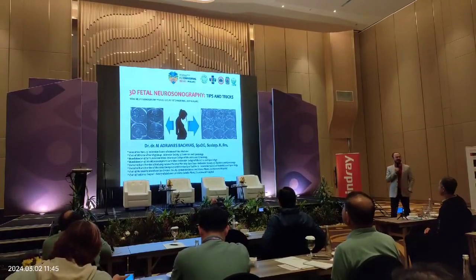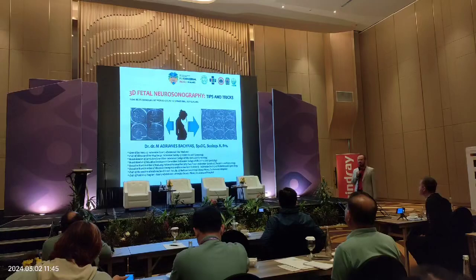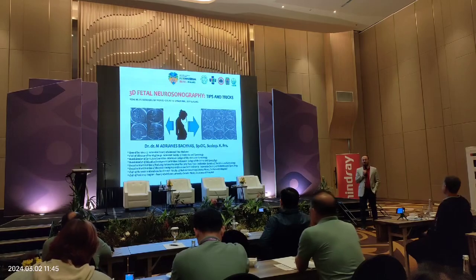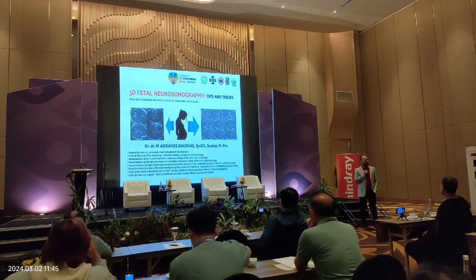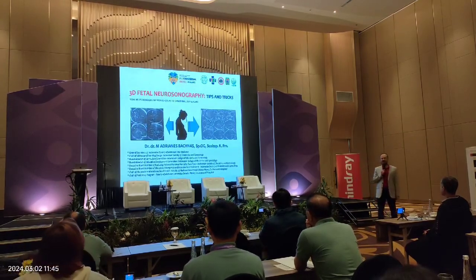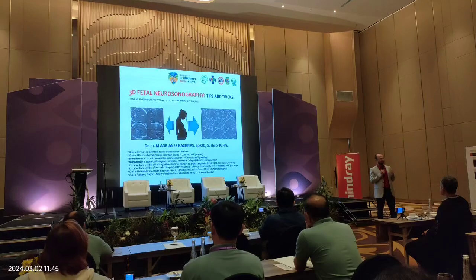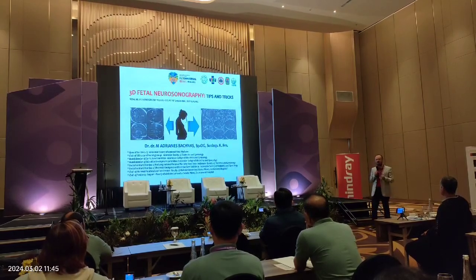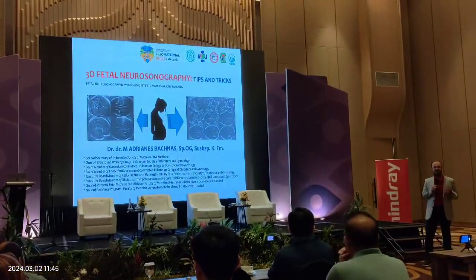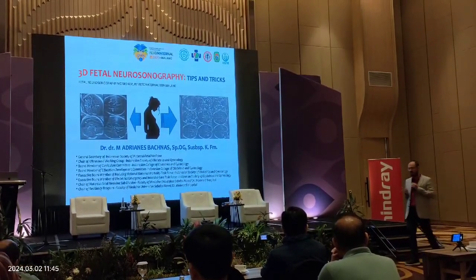Okay, dear colleagues, now I will present the next topic about 3D fetal neurosonography. I think this is relatively new for most of you. I know some of the participants here already do 3D sonography, but for most, we need to start from the very beginning: the fundamentals of doing 3D sonography, why we are not doing 4D or 5D, and the most influential tip for doing 3D ultrasound.